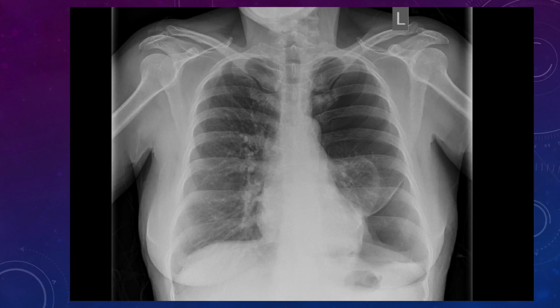And then again, mediastinal position. As soon as that pneumothorax gets large, then you start to get a tension component. Then it's going to start to push the mediastinum across. Okay, becomes your tension pneumothorax. Many causes of a pneumothorax, no obvious rib fracture. Always have a hunt round for one. See if you can see an obvious displaced rib fracture.